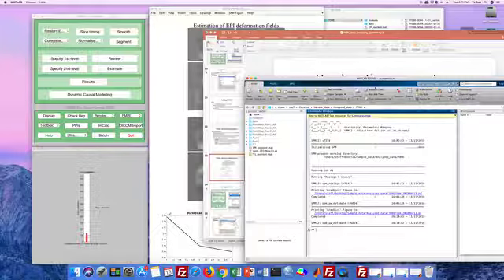So we just mentioned we have 6 parameters, right? 6 motion parameters, 3 for translation, 3 for rotation to estimate. So here you will see the information completed. You have to see it 6 times, and then we can finish this step.